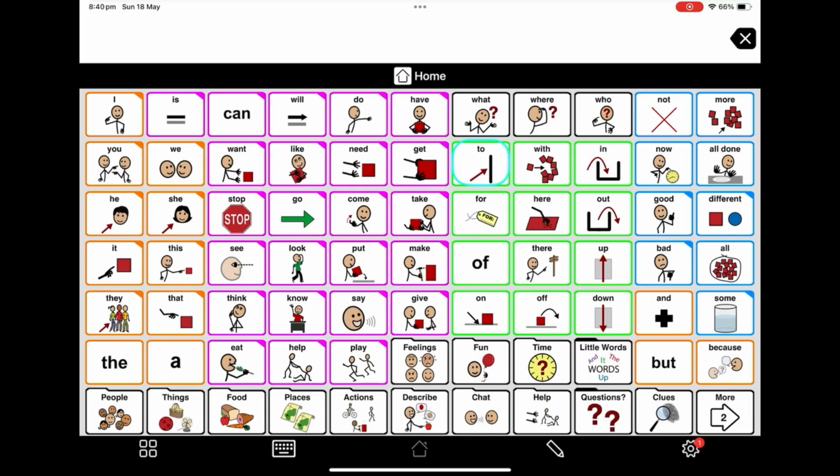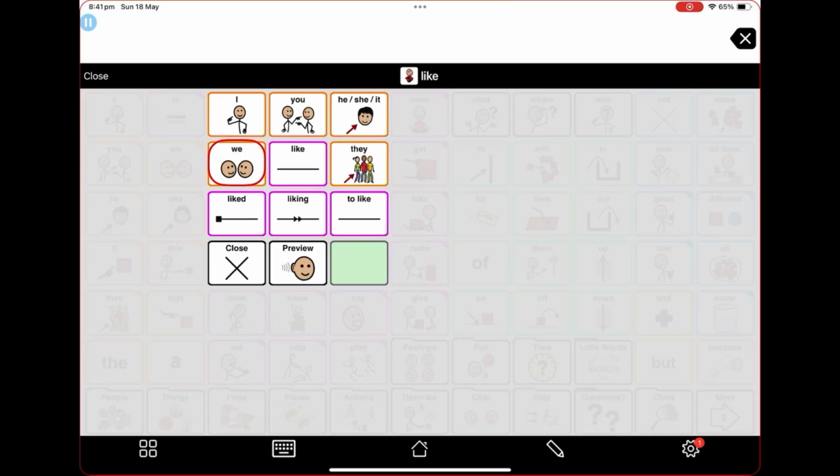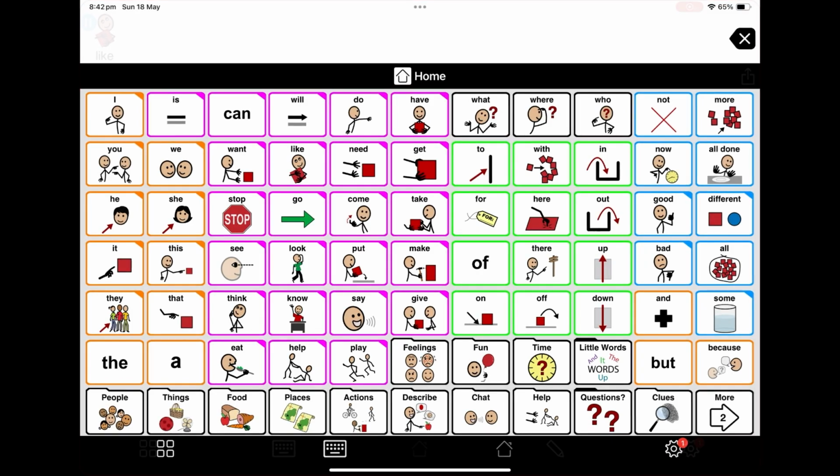There are some available touch modifications, including options for hold duration, select on release, and scanning. You can hide access to edit mode, and can put a pin on the settings. Proloquo 2 Go can be backed up via Dropbox or Google Drive. Backups can also be exported to other storage services. There is no option for remote editing.